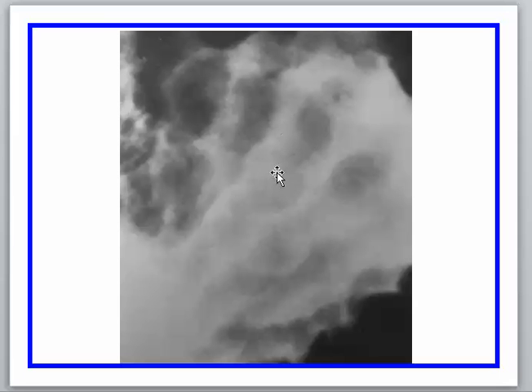This is the rugae itself, this is the rugae, and because they are bulging into the lumen, they are devoid of barium, and the line in between represents the intersection between two rugae, so it is outlined with barium. So what is barium is the intersection line between two rugae, and what is black is the raised hypertrophic rugae. These are thickened gastric folds in lymphoma.